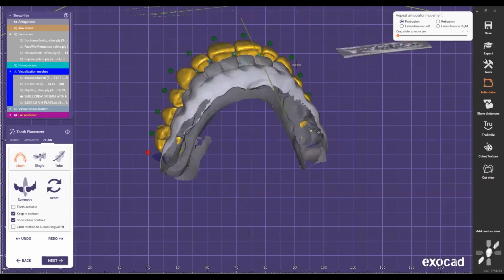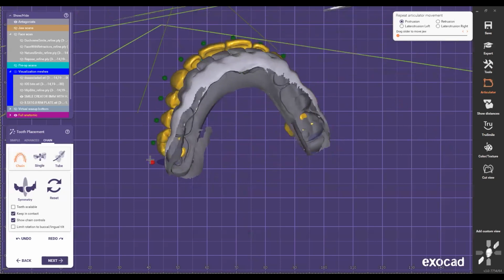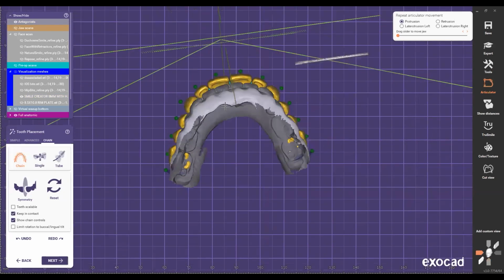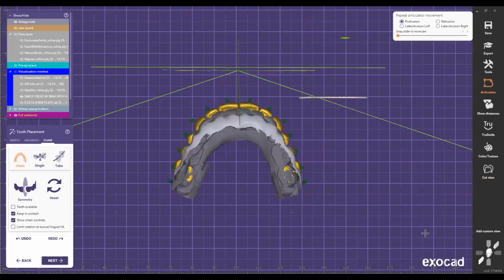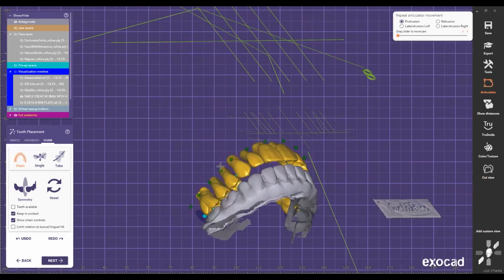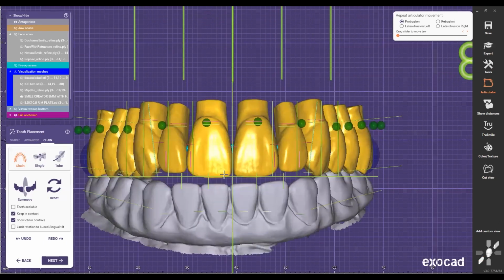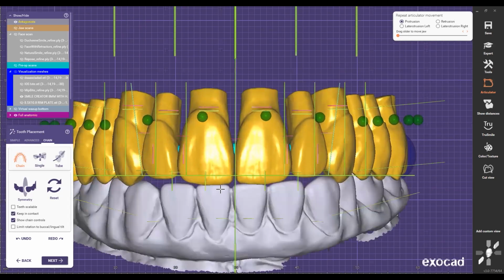So that means I'm gonna have to push him in just a little bit, because I want to make sure that I'm not gonna have that space right there. So I'll push him in just a little bit, just to keep him close. And I'm just gonna go straight, move him down, and compromise a little bit there. So I'm gonna try to keep him edge to edge, because otherwise it's gonna show the space right there.